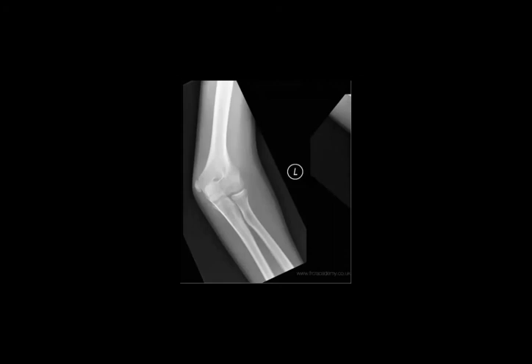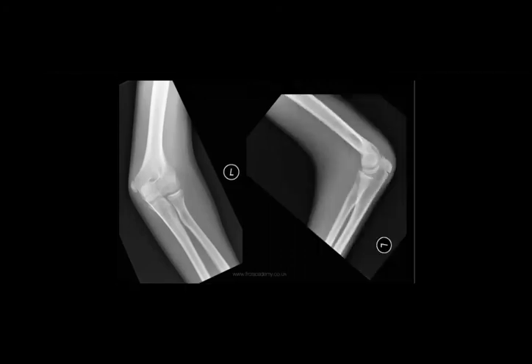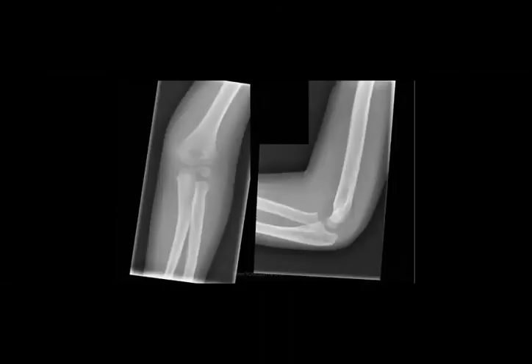And now you would like to see this one. So in the elbow in a pediatric patient, you will search for the fat pad sign, which denotes supracondylar fracture. So after you check the lines of the elbow, the radiocapitellar line and anterior humeral line, check for the fat pad sign for any supracondylar fracture. So this one is a supracondylar fracture.